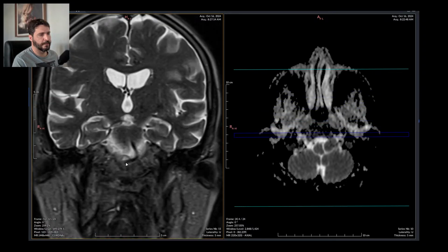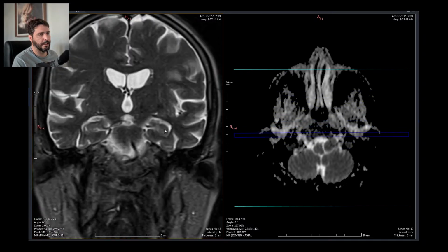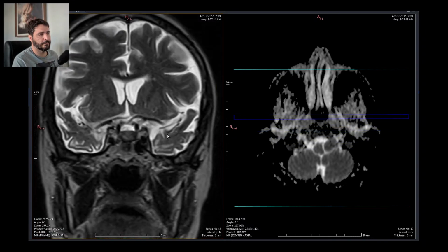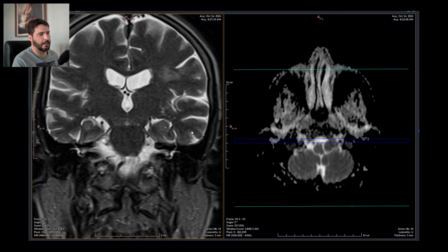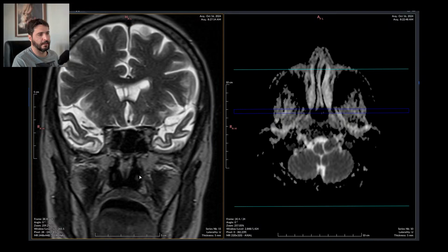You're going to report that, and the hippocampus is also maybe in MTA3 classification, could be, and the temporal lobes aren't really good. They seem very atrophic. It could be symptomatic indeed, because it has some mass effect. I agree.